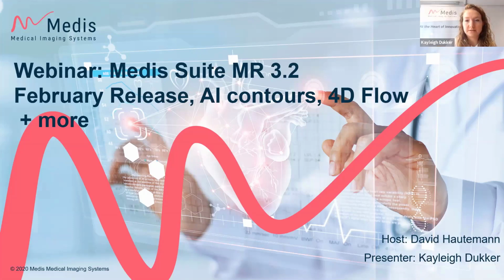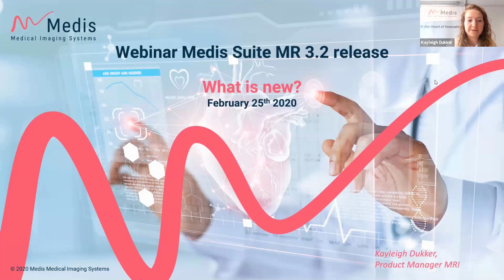Thank you, David. I will start with sharing my screen. Welcome, everybody, to this webinar regarding the new upcoming release for Medis Suite 3.2. I will focus a bit on the new things that have been released previously and what are the new things that will be released in this upcoming version. So I'd like to go through the topics we have been working on, and then I will give you a live demonstration of how it's embedded in the software.